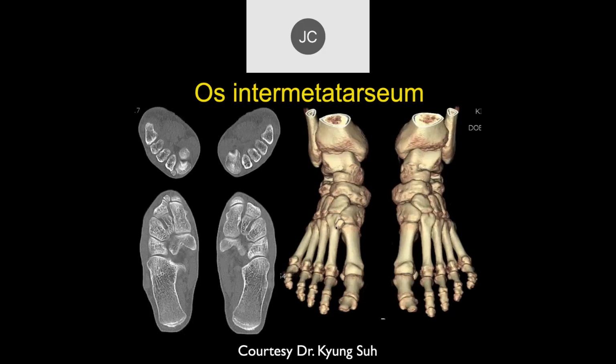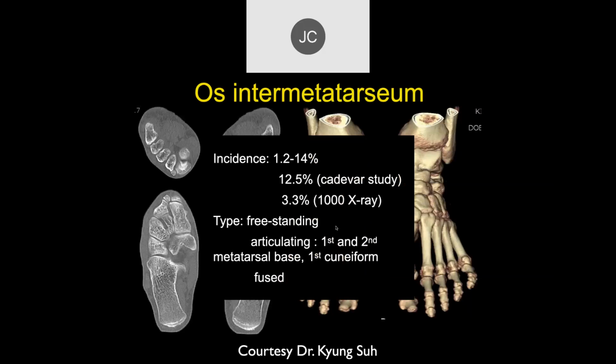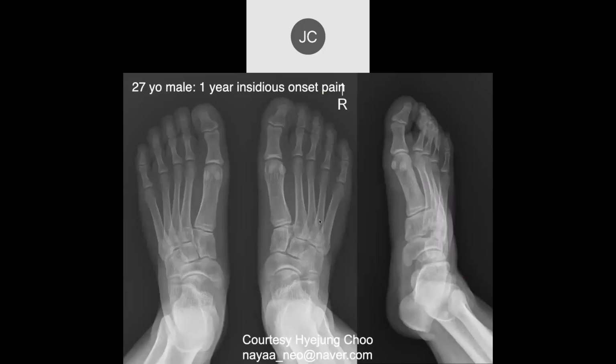That's called an os intermetatarsale. The cadaver studies show it in up to 12% of people, and X-rays about 3%. So they're not uncommon, and I think most people just pass over them.